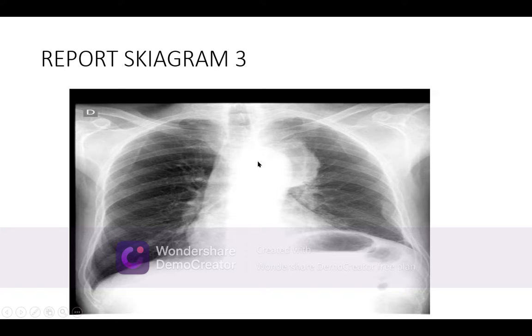The third one is that the patient is still, meaning deeply inspired and holding the breath properly. What you see is the descent of the dome of the diaphragm, and to hold the breath properly means the bronchovascular markings are clearly visible. If the person expires, then they are blurred. Quality of the film is good, it's a full film.